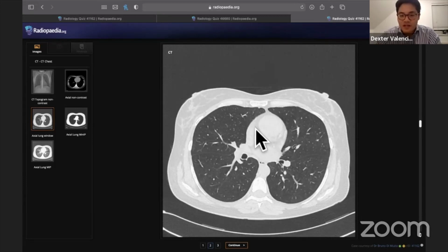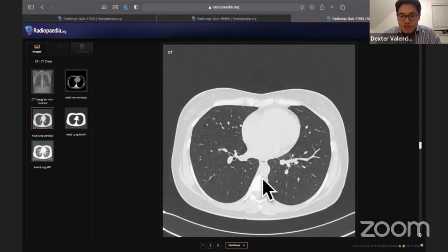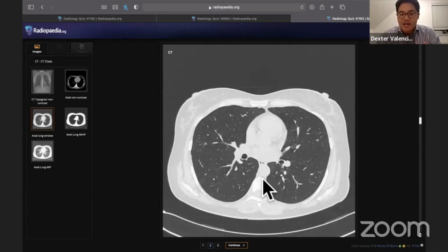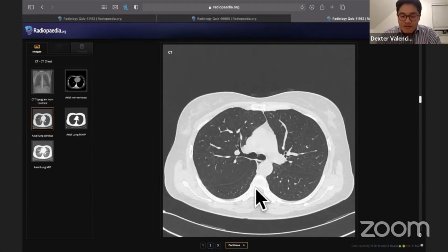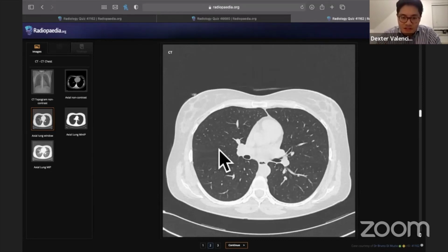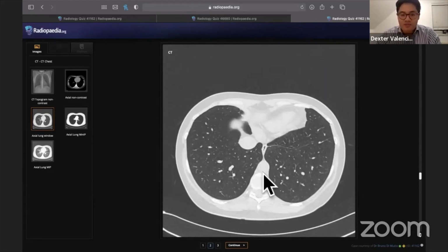These are the different lungs. These lines that you can see here, as we scroll through, you can see that they both move forward. So as we scroll and go up towards the apex, you can see they're moving back and back and back. These are the oblique fissures that you normally see in the lungs. And if you know your anatomy, on the right side, there's this subtle line here, which runs in front of this, and that's the horizontal fissure, which you only have on the right side, but not on the left side. So that's some of the basics of airways and breathing.